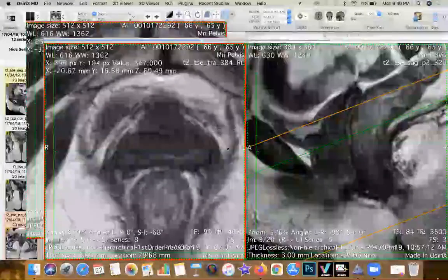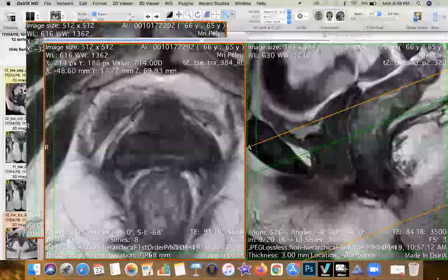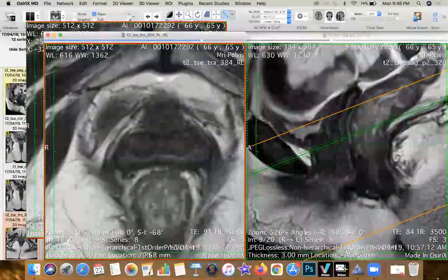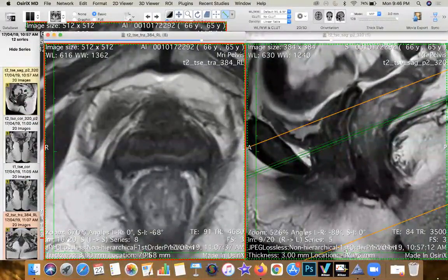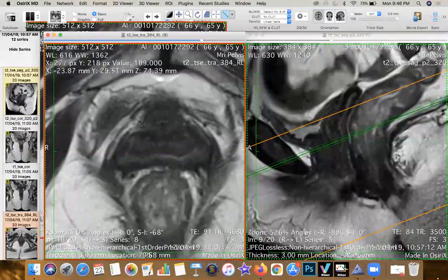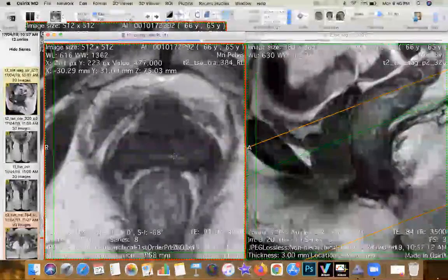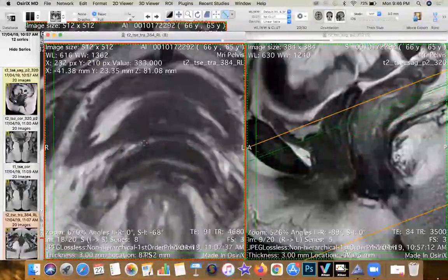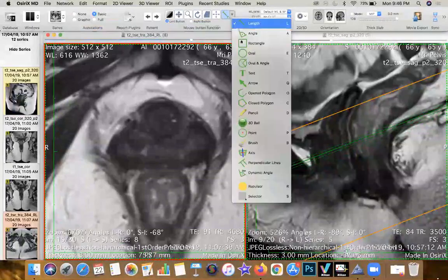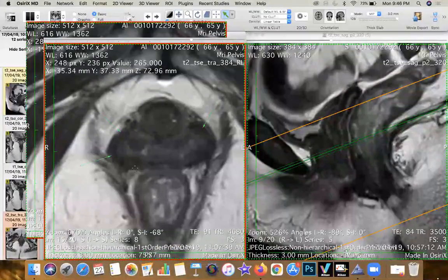As I mentioned, the condensation of the fascial reflections getting up here is the pubocervical fascia. Now, this is very important because any damage to the pubocervical fascia is going to cause cystoceles. That support to the urethra and the bladder, the inferior bladder wall, is very, very important to prevent anterior compartment prolapse. The second structure, located behind, is the vagina, which looks like a layered salami sandwich. You can appreciate very nicely the 4-layered appearance of the vagina itself. So from an anatomical point of view, that is purely the striated muscle, which is located out here.